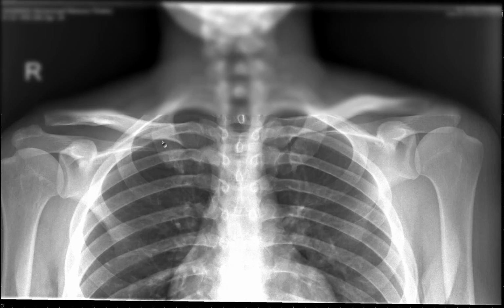If we do an X-ray for this patient, we should do a comparison study, or we should image both shoulders at the same time. You should image the right shoulder and the left shoulder at the same time. It is important because you can easily compare both sides of the acromioclavicular joint.